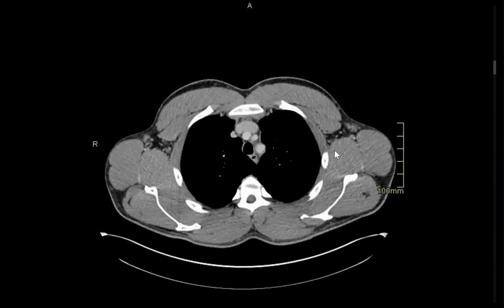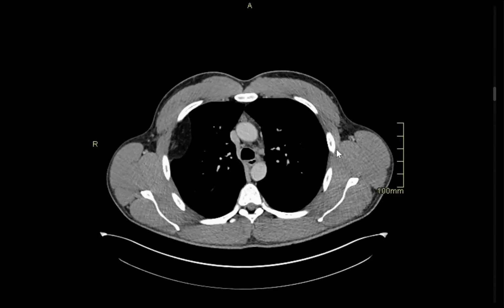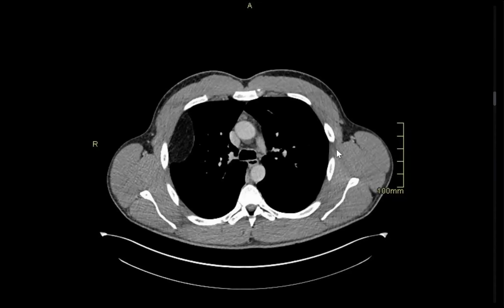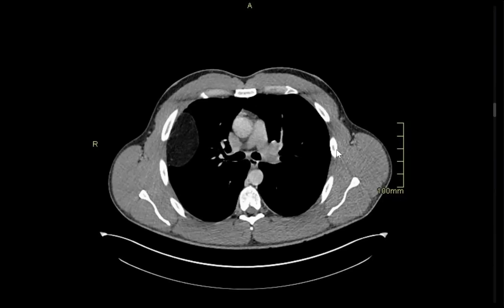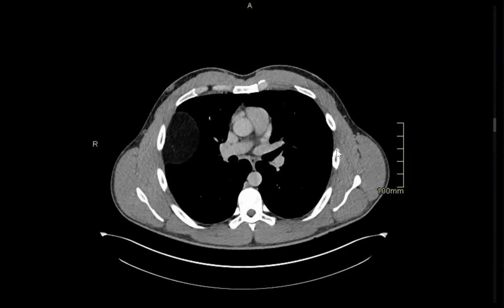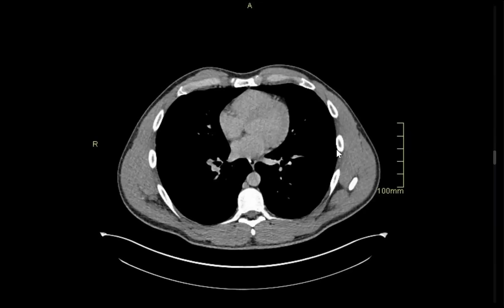This is the contrast enhanced CT scan of the same patient. There is evidence of a hypodense lesion. In my routine practice, I will scroll from the first till the last cut, then I'll give my comment. You reach the last cut and now come back to the lesion. What do you see? I'm not seeing any evidence of any mediastinal lymph nodes. Back again to the lesion.